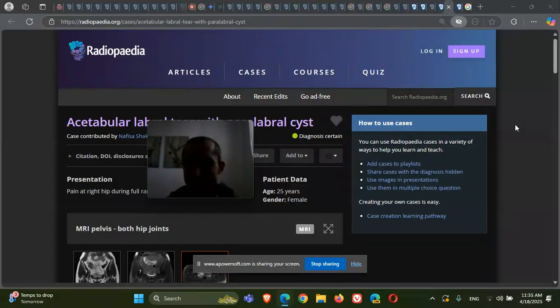We talked about the idea that proximal femoral fractures may be occult and the radiographs are totally fine. It's even hard to see on CT, but on MRI, you can see the low intensity on, for example, T1, which represents bone marrow edema, that can tell you that there is a fracture that you just missed, an occult fracture. So beware, those proximal femoral fractures may be occult on radiographs. So this is it about hip imaging.